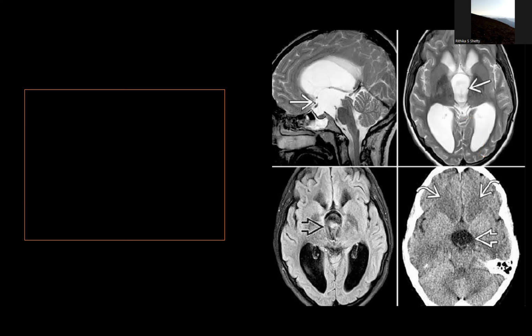But the twist is on FLAIR, it looks like it is not getting suppressed. We have studied that arachnoid should be suppressed on FLAIR. Since it is located here, it will cause obstruction in CSF flow, because of which there is a CSF flow related artifact. So how to see if it is epidermoid or arachnoid cyst, because epidermoid also is not suppressed on FLAIR?